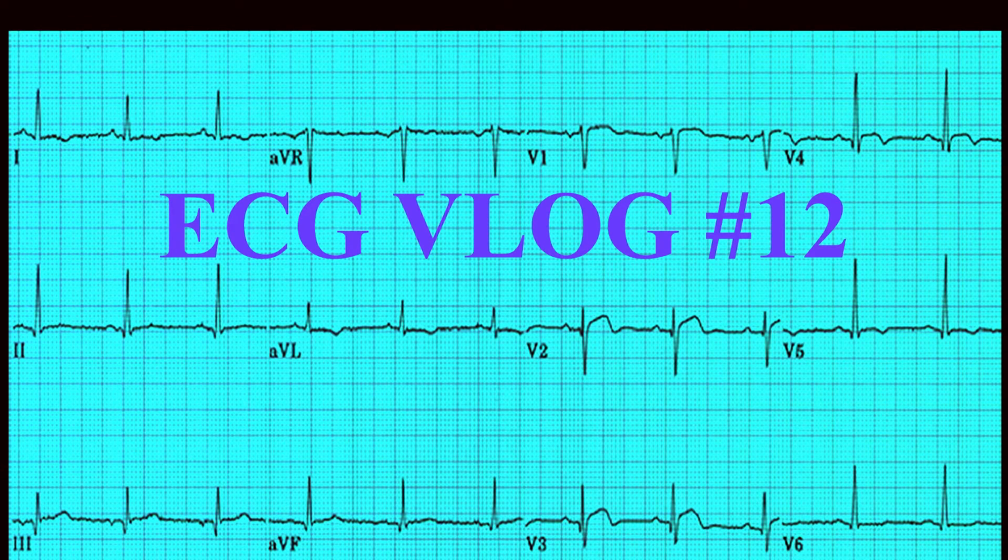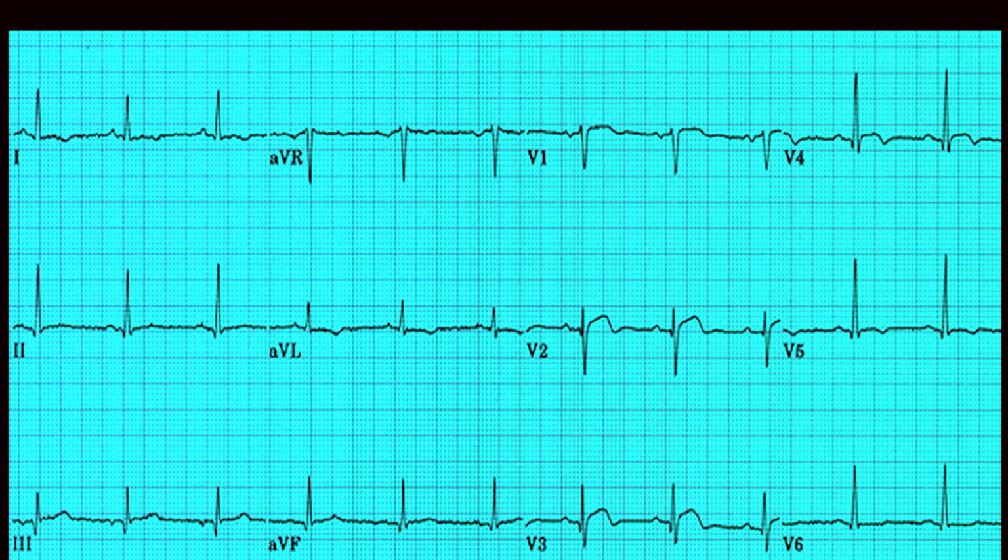In this vlog also we will be discussing one of the instances of myocardial infarction and any other abnormality also in the ECG that we'll see.